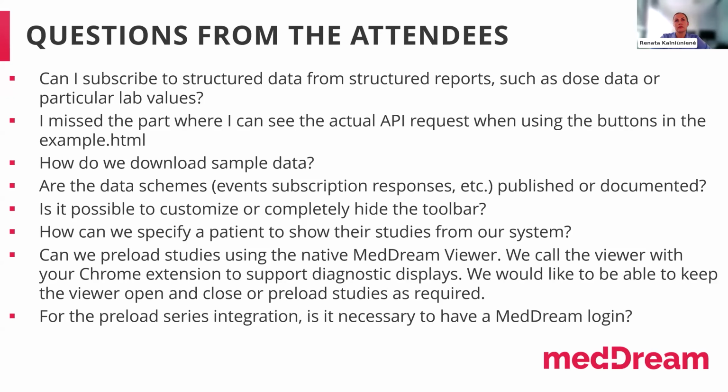I'm reading the next one. It was a comment or question. I missed the part where I can see the actual API request when using the buttons in the example HTML. Yes, in principle, if you open this HTML file in Notepad++ or whatever, you will see all the API calls.